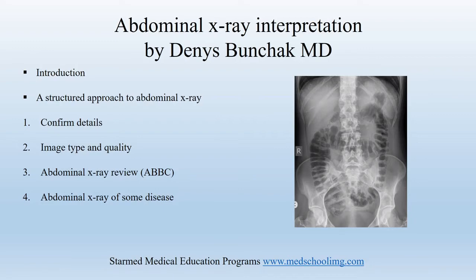I want to let you know that it's not an exhaustive list of abdominal X-ray findings, and there might be something that is missing, but I'm hoping again that I will give you insights to understand it better and to know what you see on the abdominal X-ray.